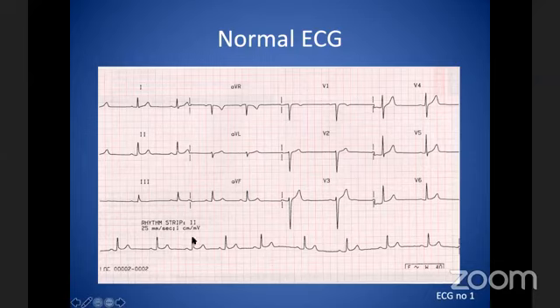Okay. So first thing first, you also have to define whether this is a sinus rhythm. By sinus rhythm, we mean presence of P wave. Okay, so if there's a P wave that's present, that's sinus rhythm. So we've defined the rhythm as sinus. Then we say if it's regular or irregular.